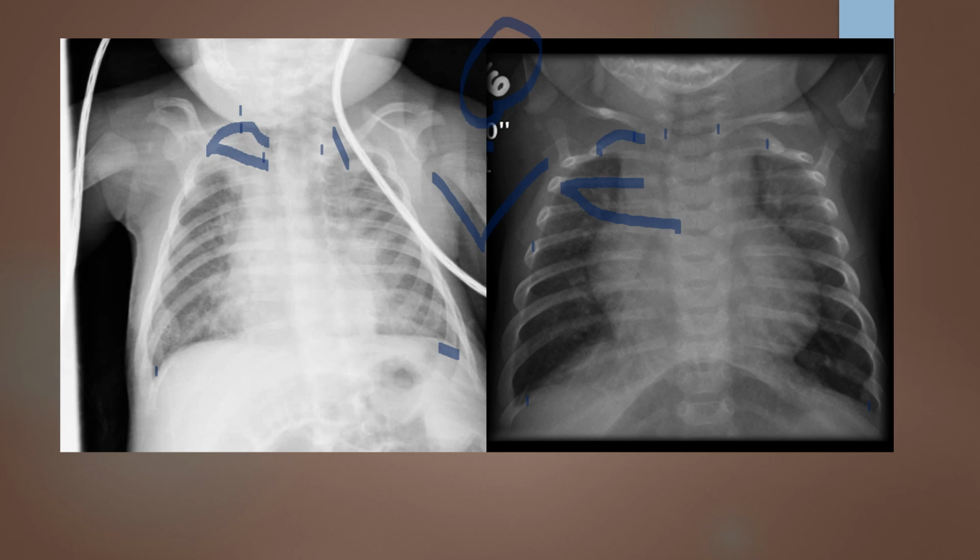So I would say we have a little bit of mid-coronal tilting, which is unlikely since that baby is in supine projection. So more accurately probably there's a central ray issue. Mid-sagittal, we look, this one is perpendicular, this one is rotated a little bit.